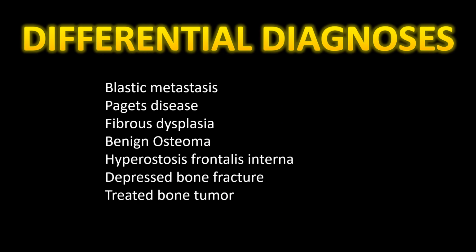And now let's consider some differential diagnoses. And here we have blastic metastasis, Paget's disease, fibrous dysplasia, the benign osteoma, hyperostosis frontalis interna, a depressed bone fracture, or possibly an old treated bone tumor. And if any of these sound good to you, let's take a look. And the correct answer in this case is a benign osteoma.